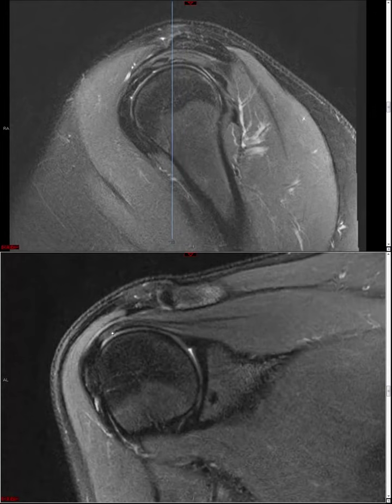Because you can imagine if you have a through and through, full thickness tear, then your joint fluid is just going to seep along here and communicate through that full thickness cuff tear and then just settle in the subacromial subdeltoid bursa. And in fact, back in the old days when they diagnosed rotator cuff tears at conventional arthrography, that's how they would diagnose a full thickness cuff tear. They would put your needle down here, inject contrast into the joint, and look under fluoro to see if any of that contrast made its way into the subacromial subdeltoid bursa, and if they saw that, then that was pretty good evidence for a full thickness rotator cuff tear at conventional arthrography.